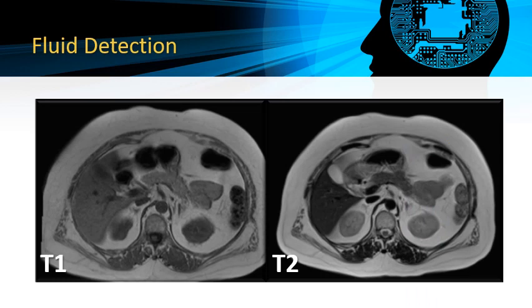Another example through the abdomen: there are two cuts, axial T1 and T2 of the abdomen almost at the same level. If we remember the fluid-filled spaces in the abdomen, what is important is the CSF within the lumbar vertebrae and spinal canal. If we check this circle, which refers to the spinal canal, and compare T1 with T2, on T1 we'll find that the CSF surrounding the cord or the conus medullaris is dark in signal, while on T2 it's bright in signal.